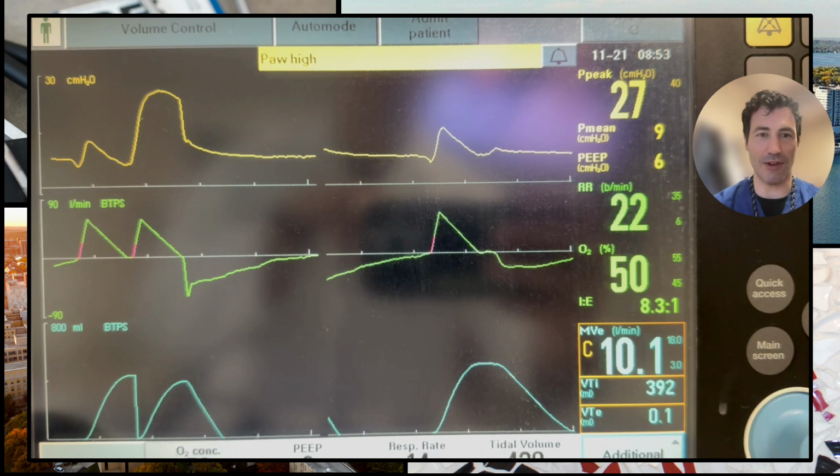It's very fixed. It's fixed by the ventilator, and we have fixed it in a decelerating flow pattern compared to a Darth Vader breathing pattern you can learn about in my other videos. When the flow is fixed, the pressure is variable. Vents aren't that challenging or smart. They're very dumb tools. They either control the flow or they control the pressure, and whichever one they don't control becomes the variable based on the patient in front of you, which you can learn about in all my other videos.